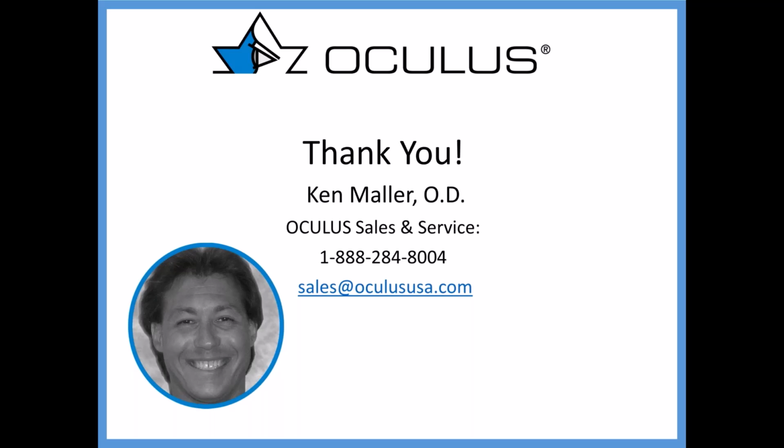So it is quite a bit smaller than that that's devoted just to near. But the value on the Wave screen is 2.5. And so that's a good place to start, and then tweaking up or down a little bit based on, for example, eye dominance. I will take that into account as well.